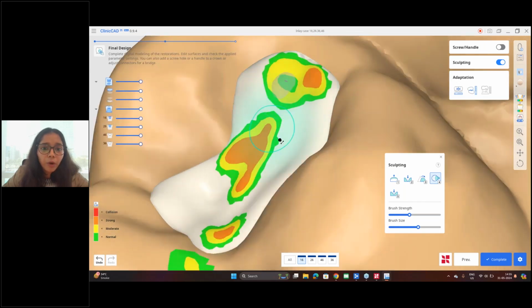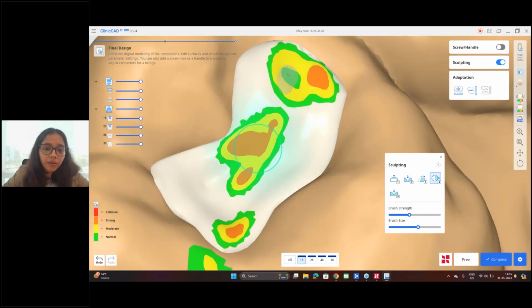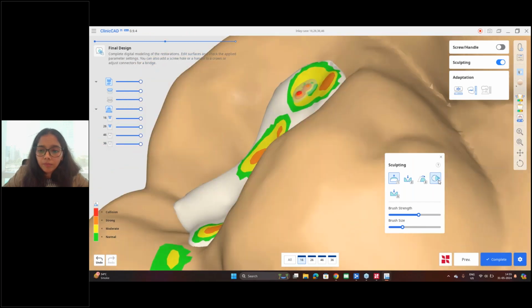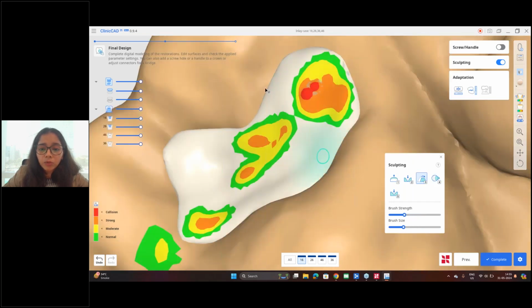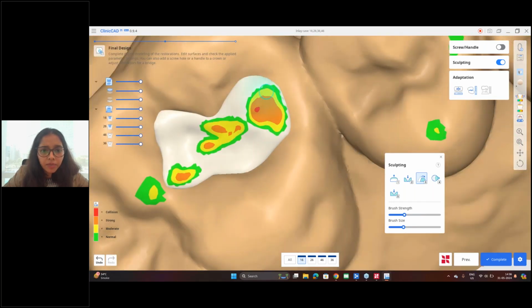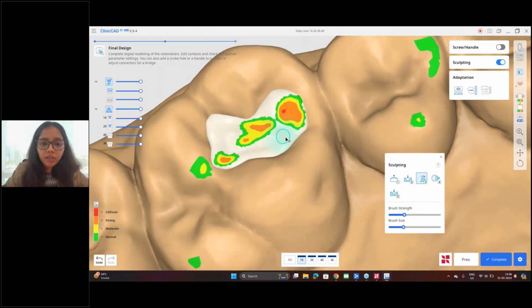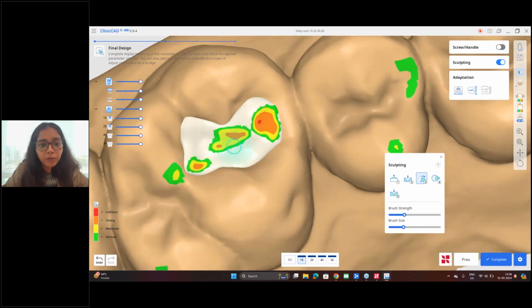Okay, it gave me high points. That is because the material thickness is very low. As you see, this is the gray part that it's coming out. So I will have to play manually over here. Now I'm using the smooth tool to just remove the bumps. Okay, so this looks good for me a bit, but maintaining the crown or inlay thickness is very important, as without it there are chances that the print can fail or even the milling machine can fail to do its job.